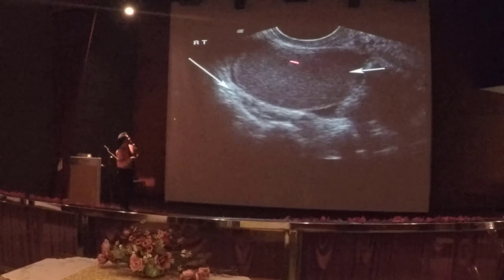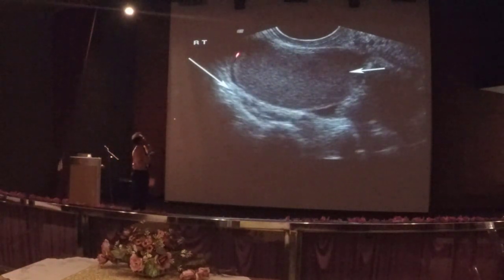So this is another example. Simple cyst, spectrum.